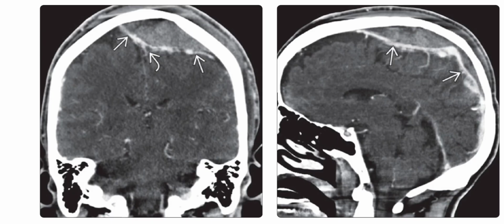Left is the coronal reformatted CTV, and it is showing the vertex epidural hematoma is much larger and now crosses the midline. The superior sagittal sinus is displaced inferiorly from the calvaria, and it appears severely compressed. An empty delta sign is also present, suggesting that the superior sagittal sinus is at least partially thrombosed.